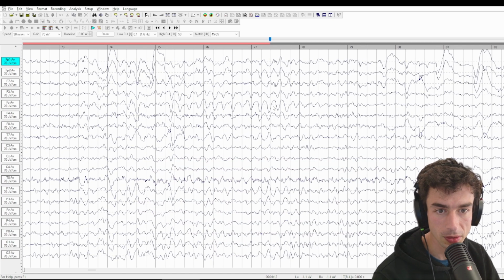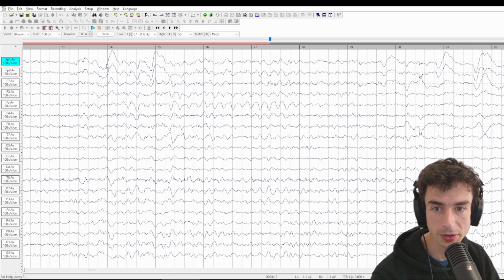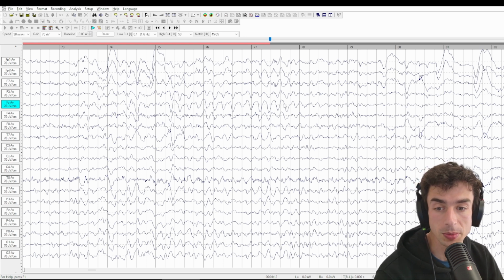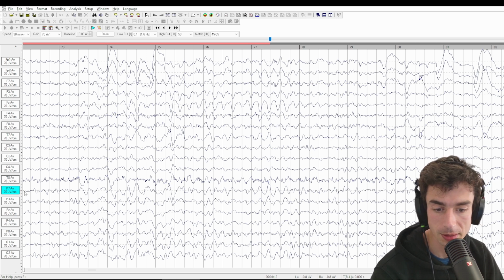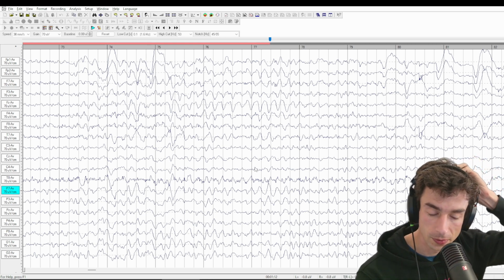And here it's a little more clearly differentiable because we have eye blink or eyelid flutter that's clearly happening here, and really more classic and obvious frontal midline theta here at FZ. And the alpha activity is increasing in the back of the head, but there's also real theta mixed in, right? Here's P7, the site behind the left ear, showing basically the same theta activity.